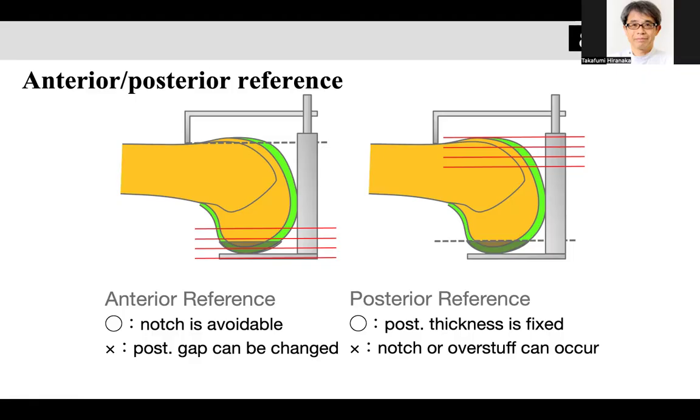That's why I prefer to use anterior reference. If I adjust to the decided sizes, 3, 4, 5, or C, D, E, we can use it as if it were posterior reference. 要は前方も後方もどちらも調節できるので、好んで使っているということですね。This is the basic. You should recognize this.